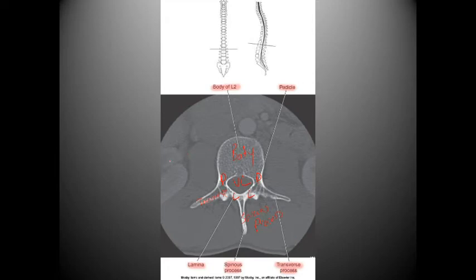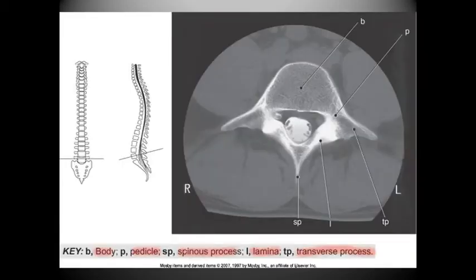Also, as we're looking at it, we have kidney here, which this would be the right kidney, this would be left kidney, aorta, once again, we've kind of seen this image tossed around. We have the body, lamina, pedicle, or sorry about that, I got ahead of myself.